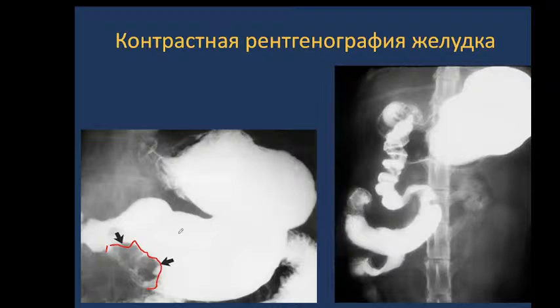Usually surgeons cut out the part of the stomach with the cancer, and then make a communication with the intestinum tenue, like here it is visible. That is the jejunum joined to the small stomach after gastrectomy.